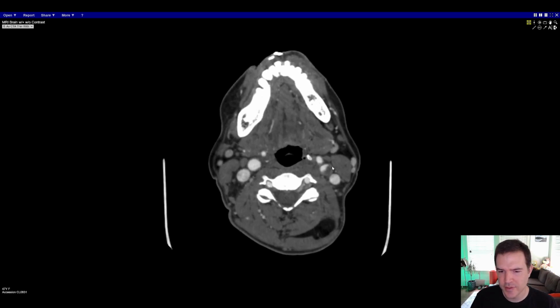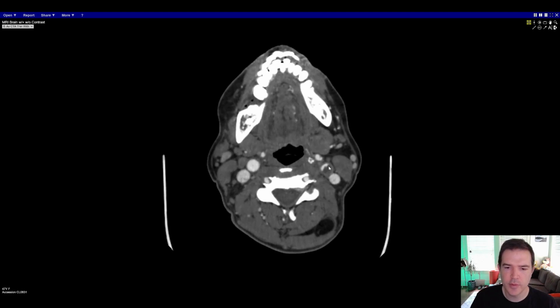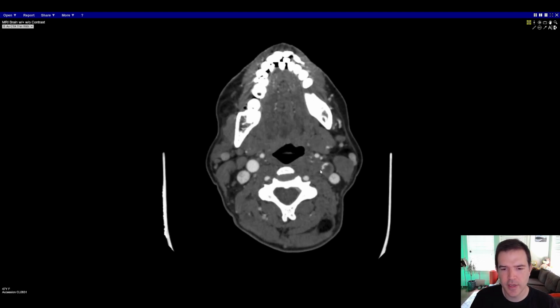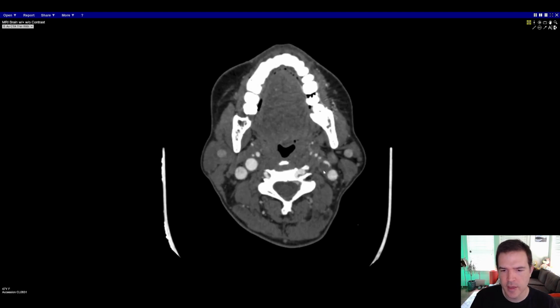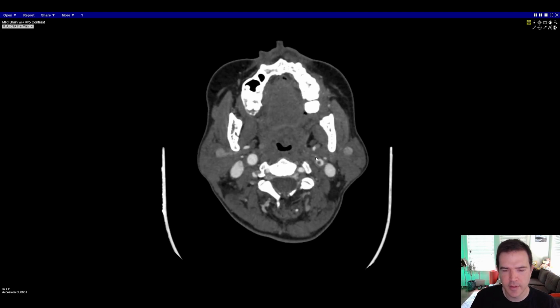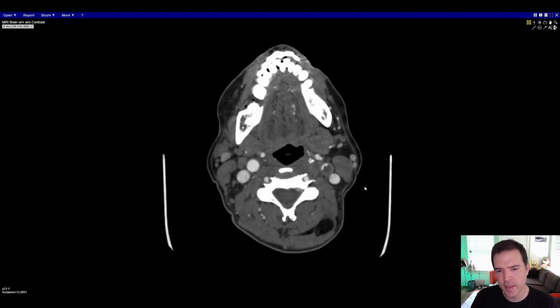We start seeing there's something funny going on here. We see some luminal narrowing, and it's a smooth tapering of the vessel with this low density material along the lateral posterior margin of the vessel. The vessel is very narrow, and that low density material has very irregular margins there. As you come up, it continues to be irregular. On this image right here, we see what looks like a low density filling defect in the middle of the vessel. It's a free floating thrombus is what you're dealing with there. So we have a smooth tapering of the ICA.